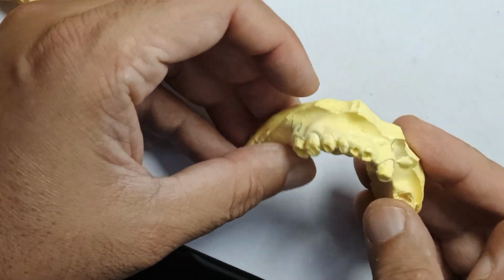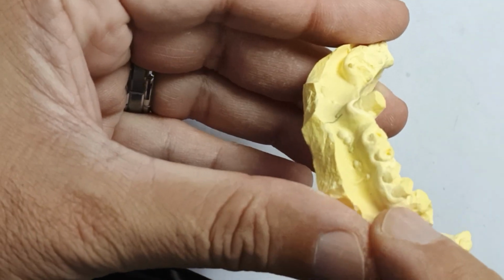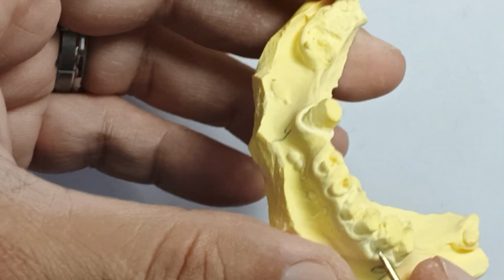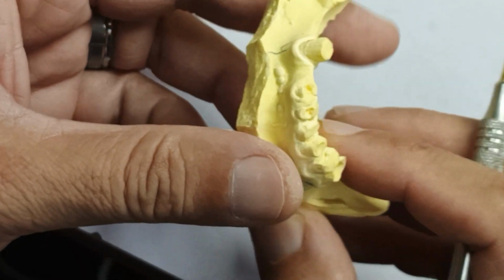God help this person, whoever it is. Look at this. They're supposed to have crowns stuck to 1 millimeter preps. Okay, this tooth and this support tooth will probably be supporting it. BDRs are there. I cannot even comment on this any further.